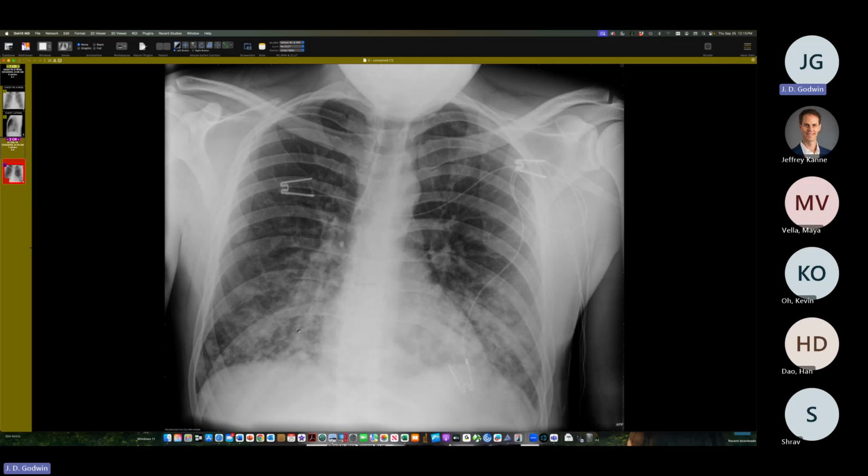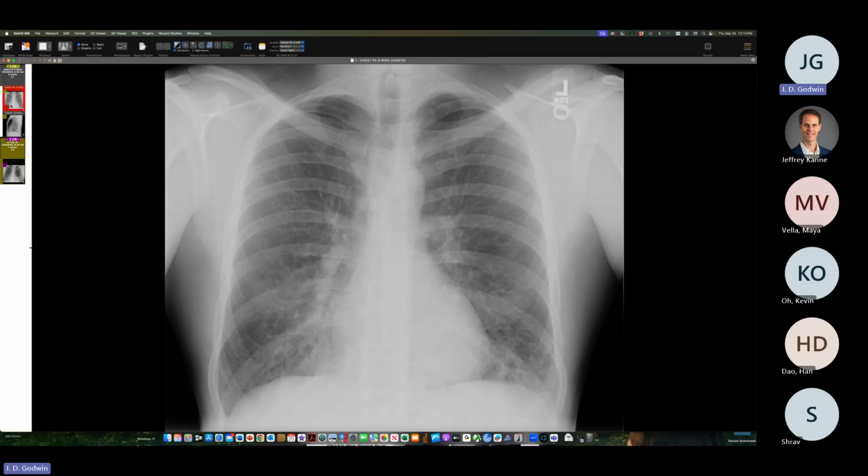ordinary lung edema. So this is what he looked like on day one. And this is day 2. He's cleared most of it already. This is pretty rapid response. So the treatment for this, of course, is to get them down to lower altitudes, and that will go away. And there can be cerebral edema associated with this, and people can behave strangely, and it's not a good thing to happen.